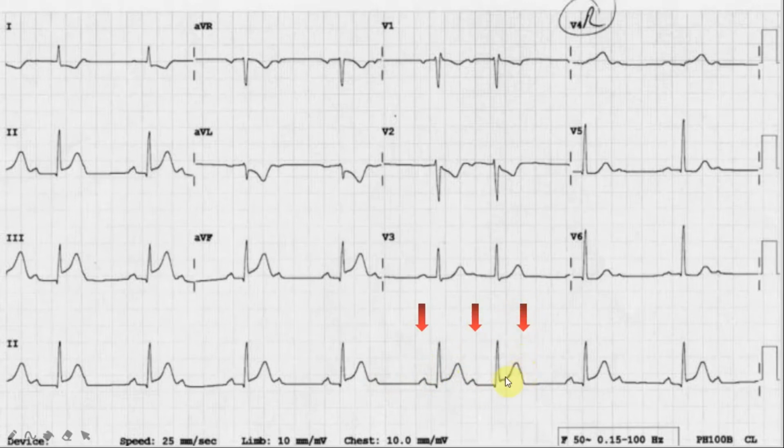That is exactly where the T wave is. So basically the T wave and the P wave are fused together, and we cannot see in this particular ECG where that P wave is. That is when we need the electrophysiological studies that can show what is happening in this area.